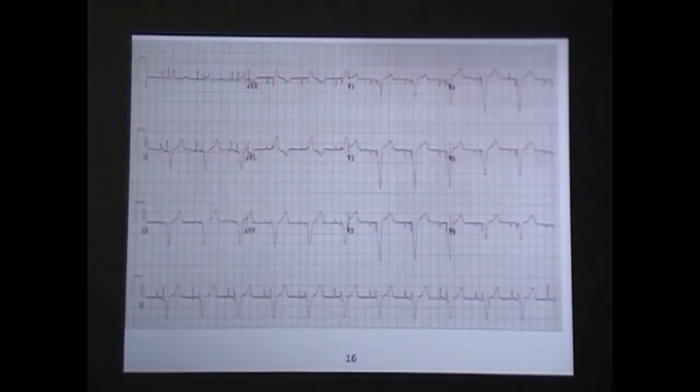The way you can tell it's atrial and ventricular is that you've got two. If that's the P wave right there, that little teeny thing, let's see if I can find a better lead that shows it. It's hard to see the P's here, because the atrium is such a small muscle mass compared to your ventricle, so you're going to have less visible electrical activity. But then I have a pacer spike and a widened QRS, so really indicative of being paced.